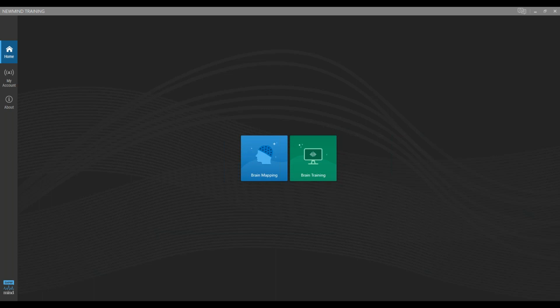It's kind of like how when we train high beta down, the default is 90%. We're just trying to lightly reinforce that, but we're not trying to heavily train it like other frequency bands that we may have set at a 75% target. And just by bringing those two thresholds up, we may see an improvement in the training efficiency, because now their brain really only has to focus on the 2 to 7 down. So we're just kind of easing up on them.